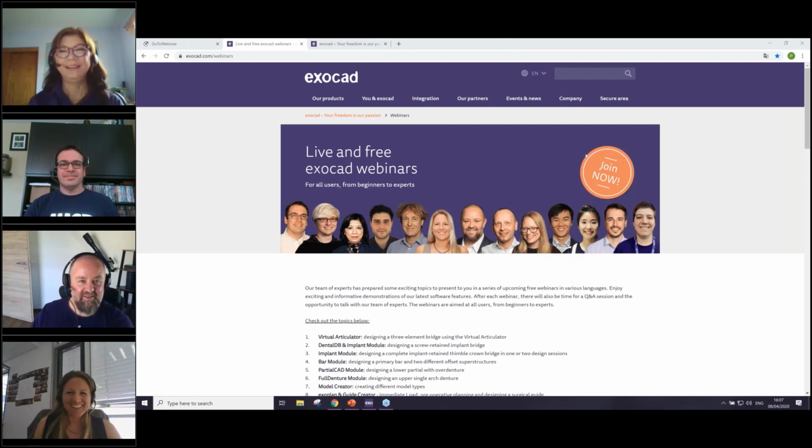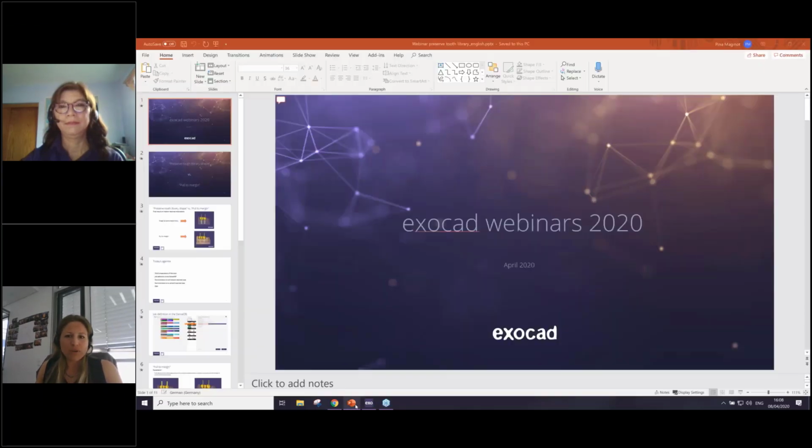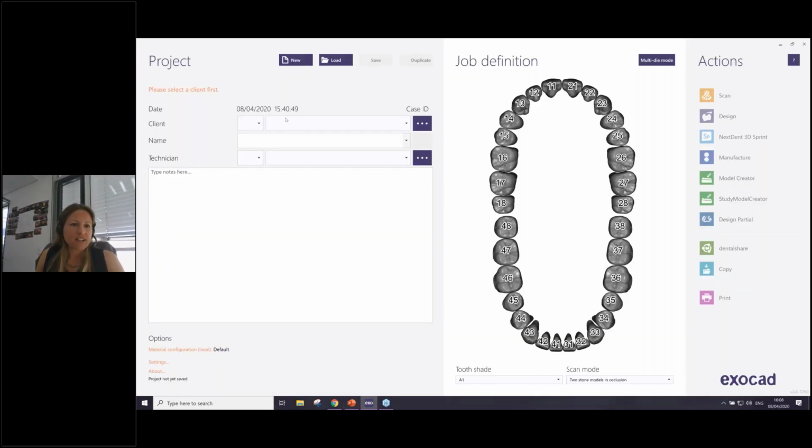So once again, I will repeat the topic of today: DentalDB. I will explain some basic features and how we start with a project. We have the implant module, where we will design a 3-element bridge. And on top, what is new in DentalDB is one new parameter which we can choose. I have a small presentation for this webinar, and over here I can start it. At first, I'm setting a client.